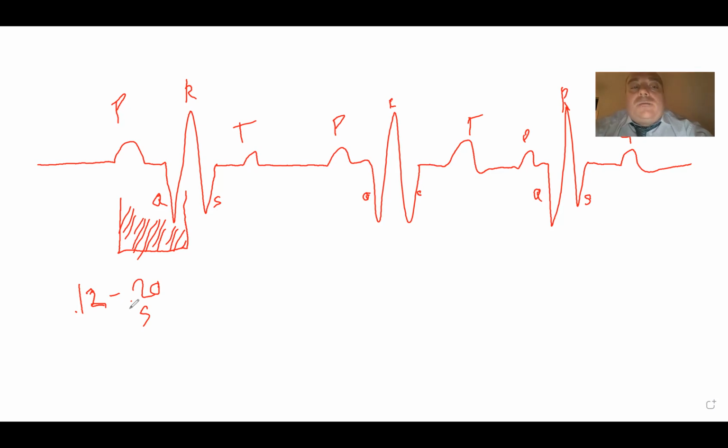So next, just moving left to right on all of this here, what we can measure is the width of the QRS, okay? So the Q, which goes here to about the S, so about here, and we can measure this width in here, okay? All right, so why does this matter? Okay, what's going on here? The ventricles are depolarizing, ventricles are contracting, okay?